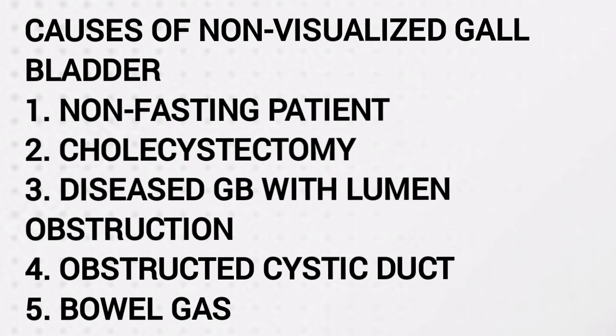The patient has had a cholecystectomy, especially laparoscopic cholecystectomy. It can also be a diseased gallbladder with lumen obstruction. A small, shrunken, and contracted gallbladder in chronic cholecystitis is difficult to visualize.